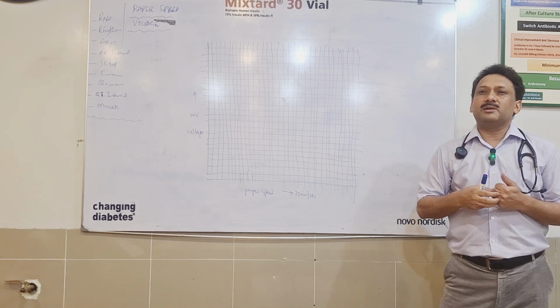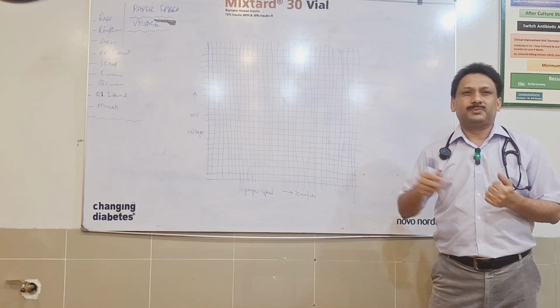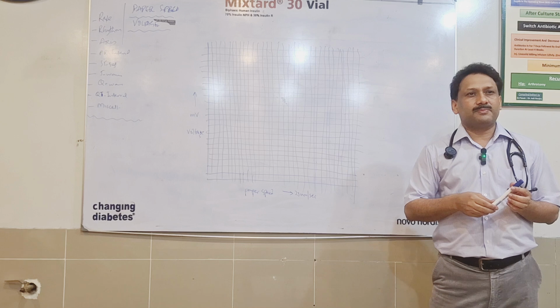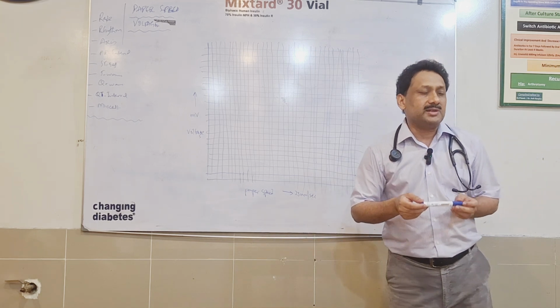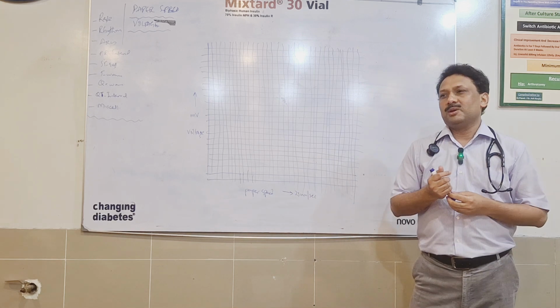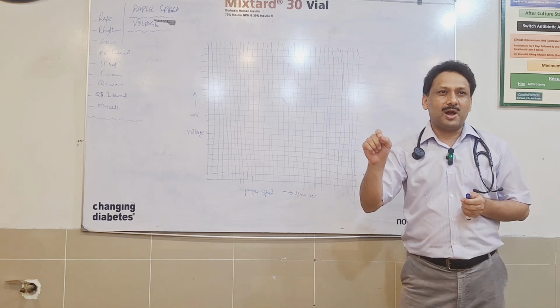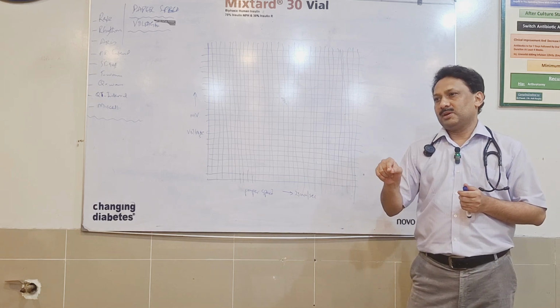Today's session of ECG is about certain very important things. As you have gone through different ECG waveforms in different sessions earlier where we studied multiple things, the most important thing is that as you are going to interpret an ECG, as you get hold of that ECG paper, you just immediately jump to abnormalities there. And that's the basic issue.